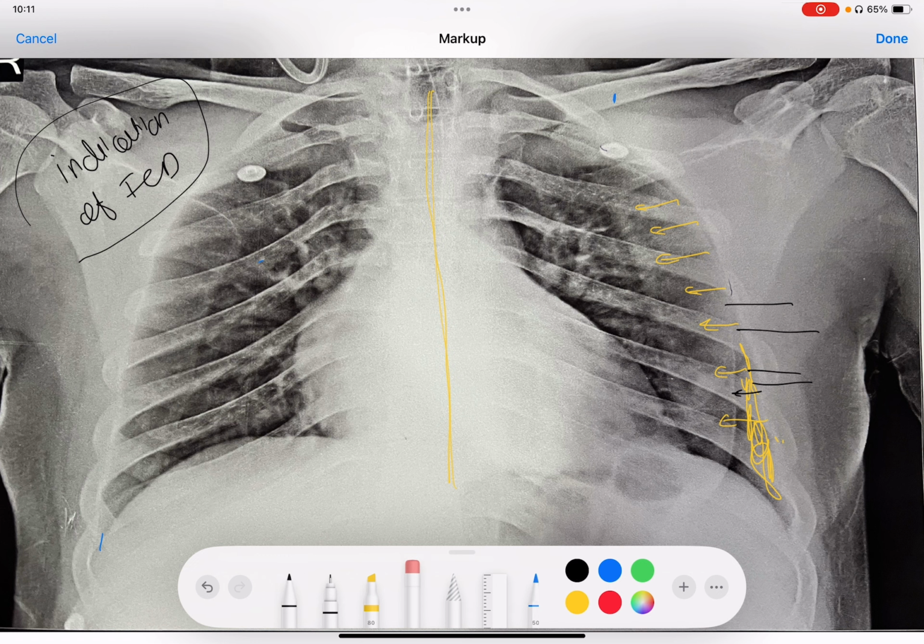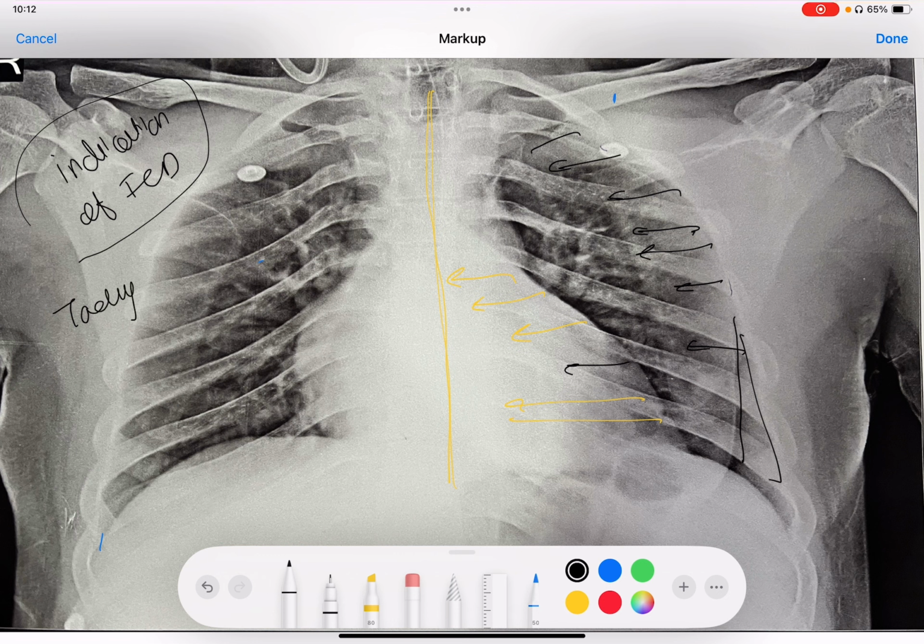So as we can see in here, the lung collapse is very mild. In fact, it's very difficult to see this pneumothorax also. But when pneumothorax is significant, it simply causes collapse of the whole lung. As soon as it starts pushing the heart towards the opposite side, the patient may have tachycardia. If it is on the right side, it will push on the right atrium, and if it is on the left side, it will start pushing the left ventricle and left atrium as well.